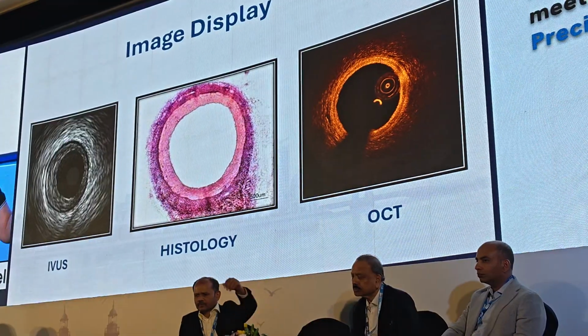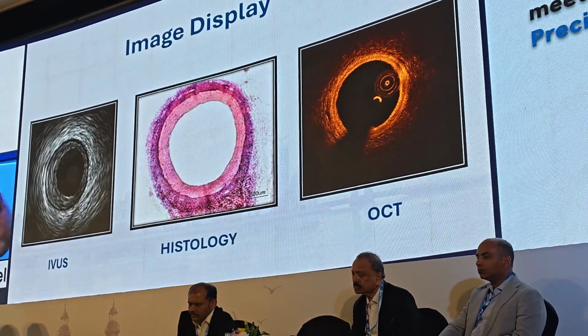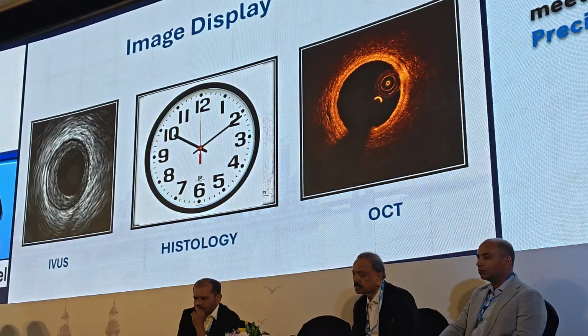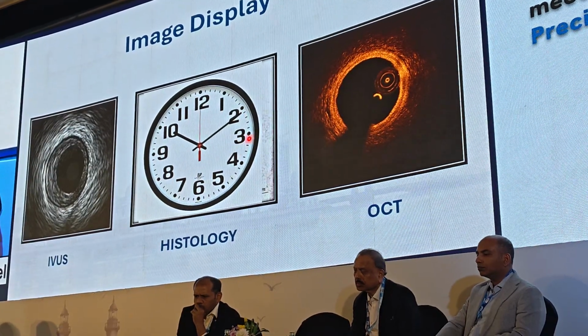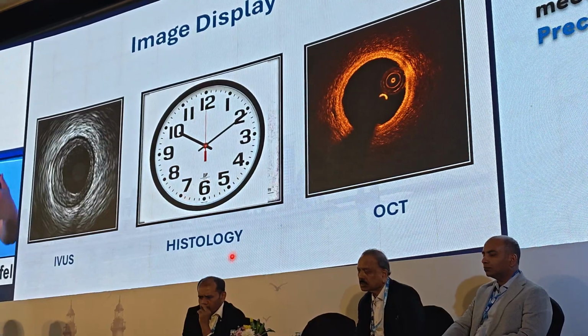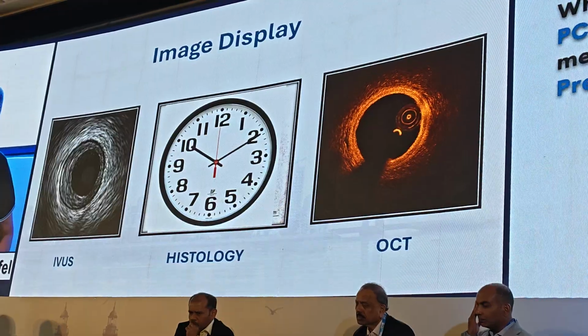want to then communicate that in our report or to our colleagues, and we generally go the way histology does, and that's with a clock face. So, you know, the lesion is at 3 o'clock or is it at 7 o'clock, and that's a good way of looking at and describing these lesions, so remember that.